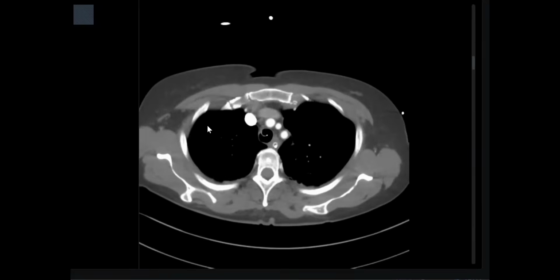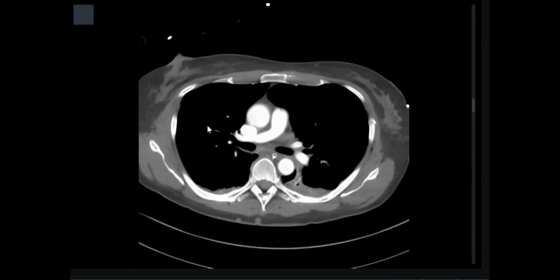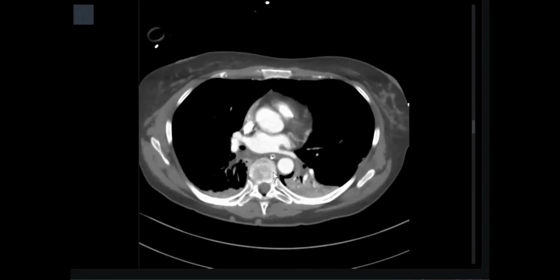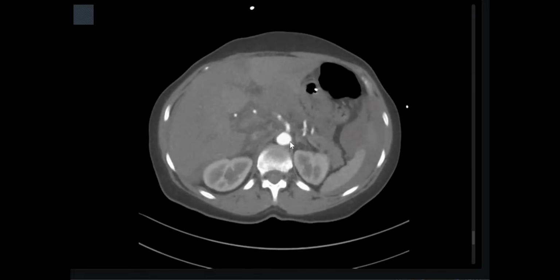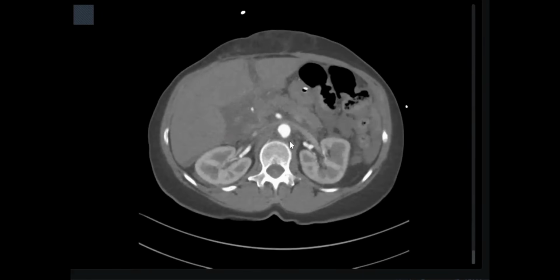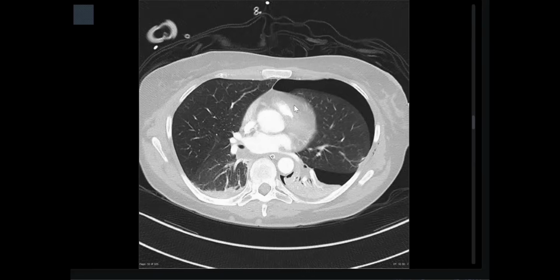You mentioned no pneumothorax and pneumomediastinum in this window. Are you sure? No, I actually have to examine it on the lung window because I'm not sure on these. Okay, thank you. So very good, my friend. And pertinent negative, no mediastinal hematoma. What do you see here? I think it wasn't wise to comment on the soft tissue. Great lesson: comment on every finding on its specific window. So I retract that statement.